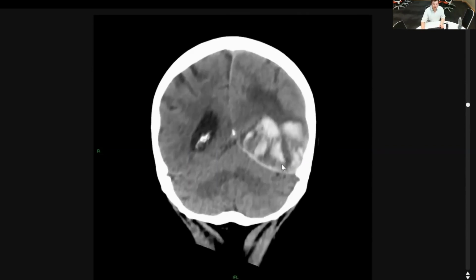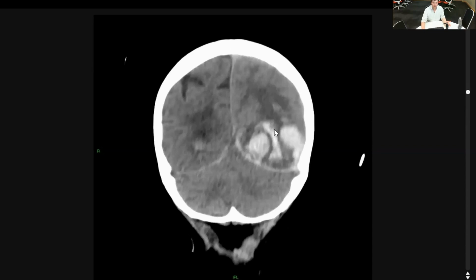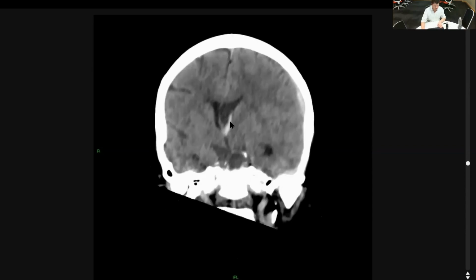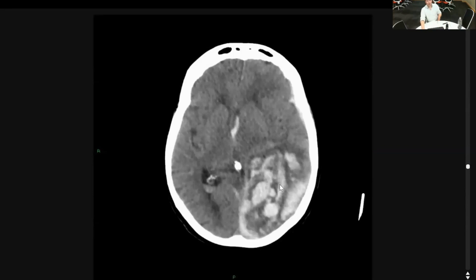Yeah, so there's quite a lot going on in this case. We've got this big blob of blood, but if we think about where the blood is, it's mostly in the brain parenchyma. So you just kind of have to say, listen, there's more of it here. It's going to be a primary parenchymal bleed. And you're right, they do have, you've spotted the kind of this very thin subdural over here and the intraventricular extension. So there's a few things in this bleed which is kind of weird and it's worth commenting on.